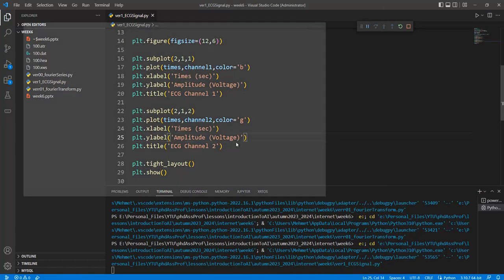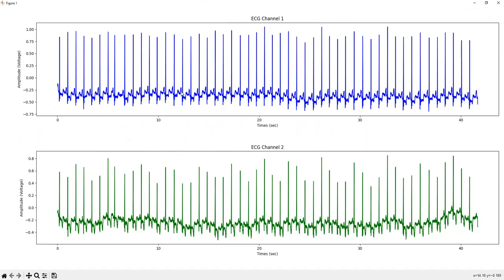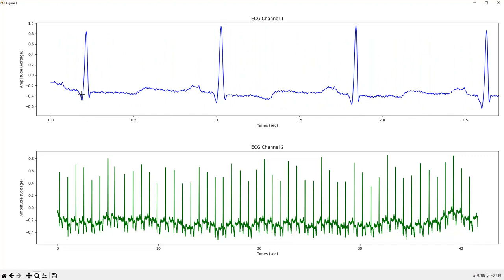And so if I run this code, then we will get the ECG channels or ECG values from some patients, right? And so these greater values represent the QRS signal, okay? And these terms are in the other section. This is the QRS signal, and we will find out this pattern from your neural network, okay?